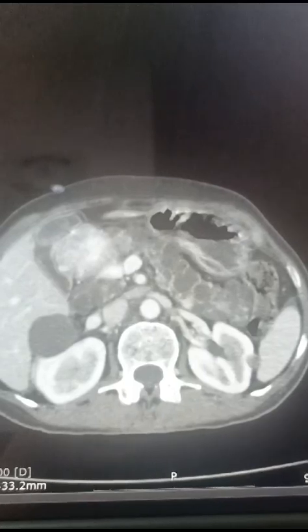This is the portal venous phase, and we can better appreciate that this mass is showing central contrast enhancement, while peripherally it is showing contrast washout. And these pancreatic cysts are more evident by relatively more enhancement of intervening septi. So we can better appreciate the bulky pancreas which is completely replaced by pancreatic cysts and a mass in the region of head of pancreas.